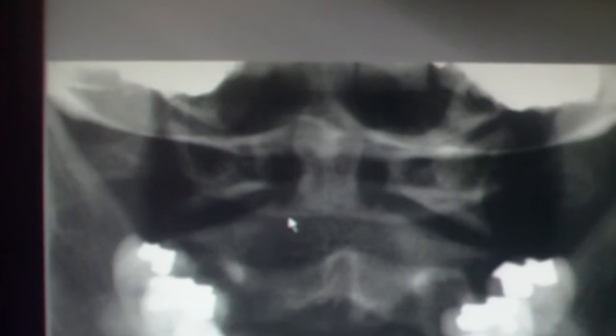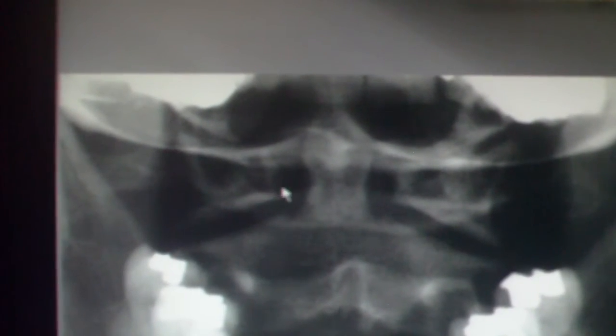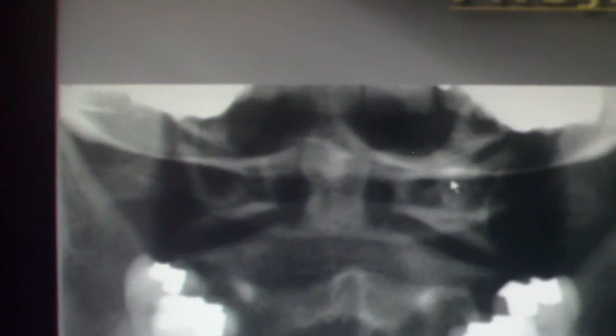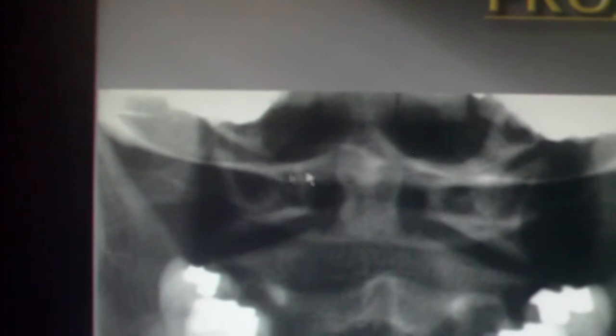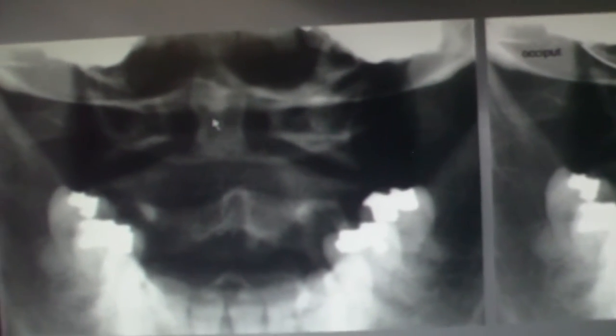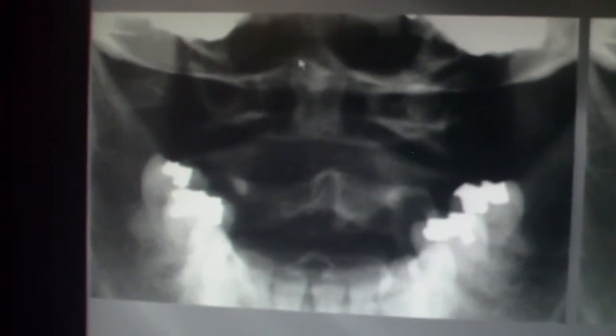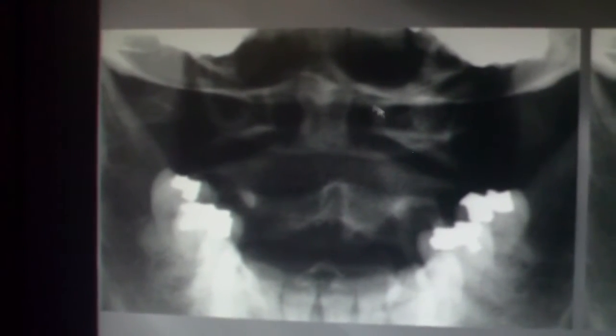This would be the inferior aspect of the posterior arch. I think we're seeing the superior aspect of the posterior arch, and I sure as heck can't see the anterior arch because the base of the skull gets in the way. Right? And that's okay, this is still a good view of the bone. And then this is the base of the skull here, this is probably EOP, and a little wavy one is IOP, but I'm not asking you to make that distinction.